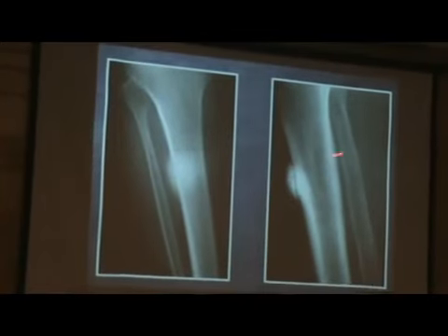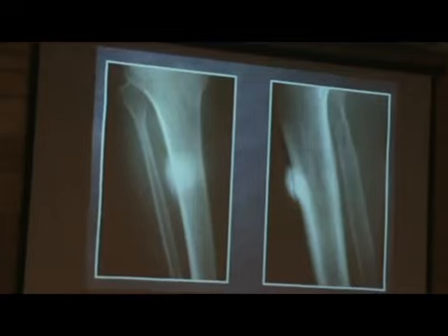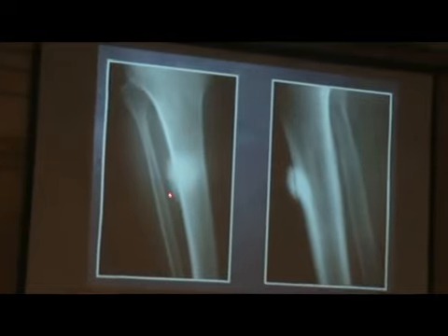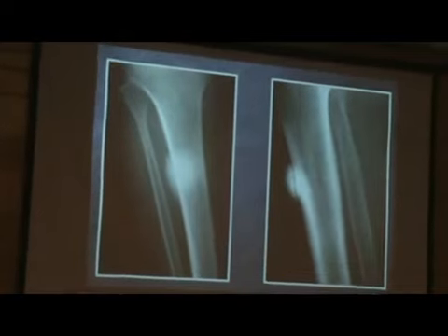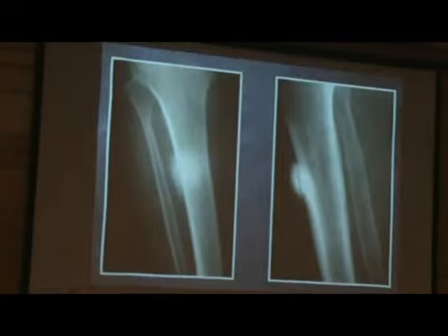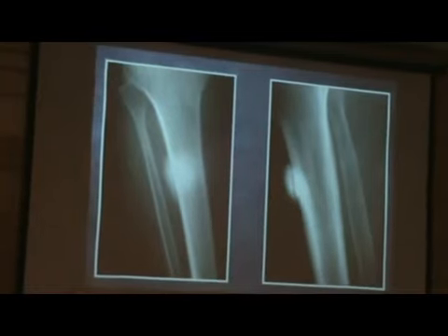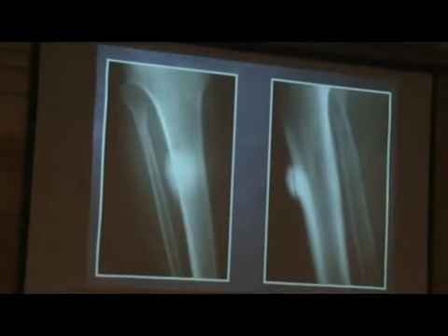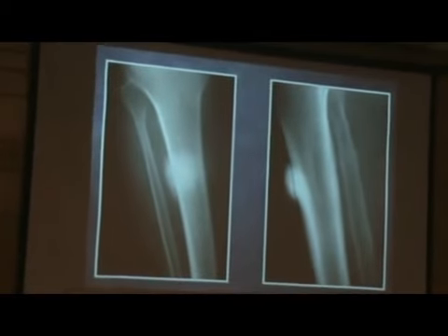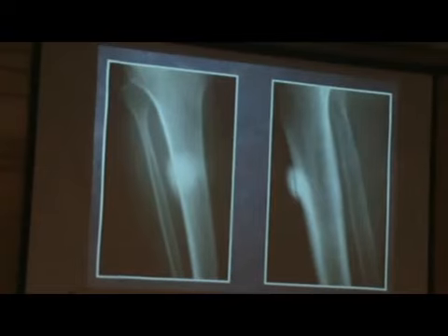And this is an example of osteoid matrix. Compared to chondroid, this is much denser. It's almost cloud-like. In this patient with parosteal osteosarcoma, you can appreciate the density and the uniformity of the periostitis. In addition to that, we also see this lucency that's going underneath this tumor, between the tumor and the underlying bone. This is a cleavage sign we typically see with parosteal osteosarcomas, and the idea behind this is that the parosteal osteosarcoma probably arises from the outer layer of the periosteum, giving this cleavage sign on the radiographs, which is quite helpful when you see it.